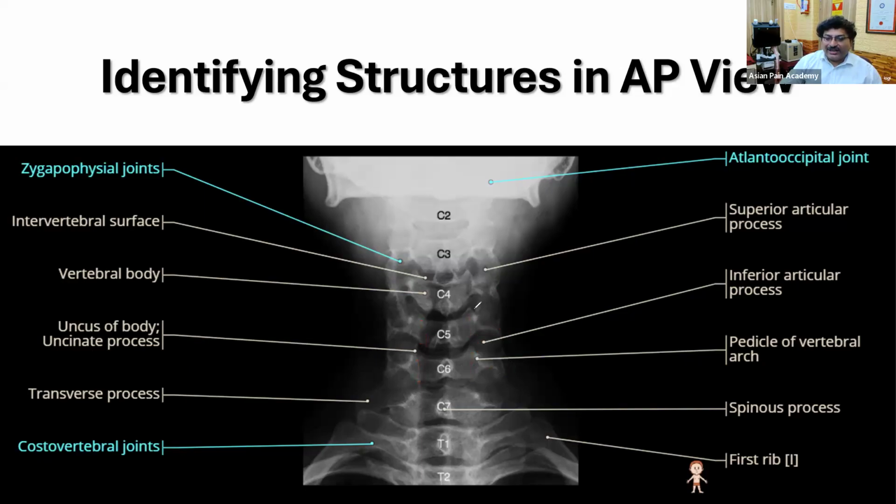So if you look at this area from the anterior side, this area is a very sensitive area. But from the posterior side, you are safe because either you will be hitting the lamina, or you will be hitting the posterior part of the articular pillar, or it will be going to the ligamentum flavum. Okay, the ligamentum flavum is the only risky part. For other areas, it is comparatively safe.